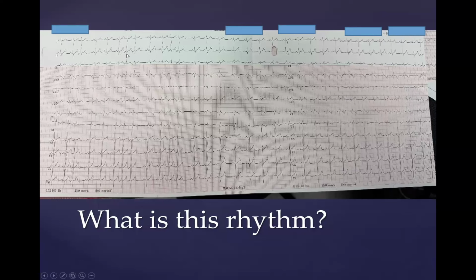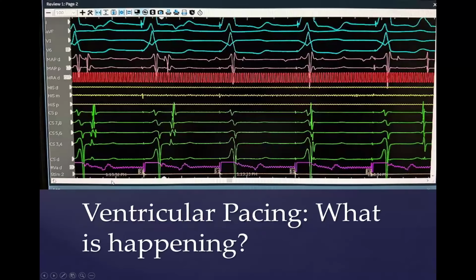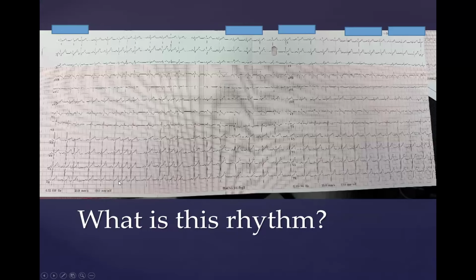But every single time we have a fast beat, we have this inverted P wave in lead 2, right? V6 is harder to tell, but if you look carefully at V6, I think you can see also that this P wave may have a similar polarity, but it's clearly different than this P wave.